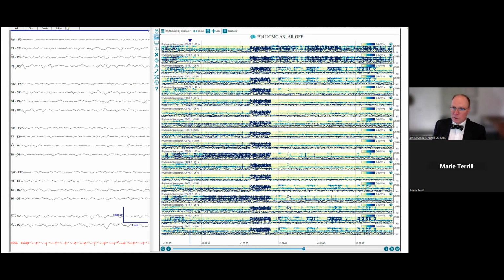One thing that I did want to show you is, if you look at this, you can see a difference in the rhythmicity spectrogram early in this seizure. And where is it? It's at FP2 to F4 and FP2 to F8. So it's kind of cool. Play around, if you haven't already, with the various panels that Persyst has to offer, depending upon the circumstance and what you're interested in. But there's a lot of information that you can derive pretty quickly from the various panels.